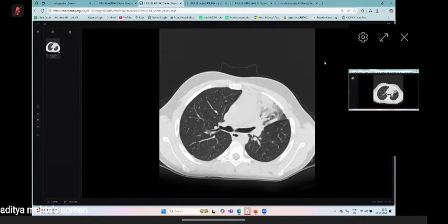Sir, my concern is that it could be tuberculosis. And secondly, I'm thinking of mucus plugging secondary to chronic asthma, resulting in allergic bronchopulmonary aspergillosis, or any genetic condition which causes mucus plugging. Cystic fibrosis is the other. It can be an early presentation of cystic fibrosis in which there is not a gross dilatation of bronchi.